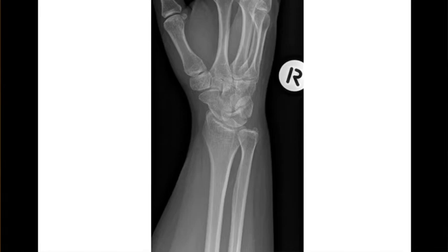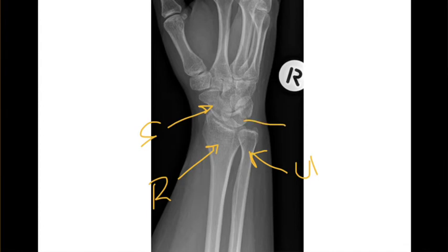And then on your oblique view, we can label once again. Obviously, we have the radius. And remember, these articulations are extremely important as the function for the patient becomes detrimental in distal radius fractures. So let's label the scaphoid bone here, and then you can see the upright cup of the lunate. Then you have the triquetrum. Here you can't see the pisiform bone, but here's the trapezium.